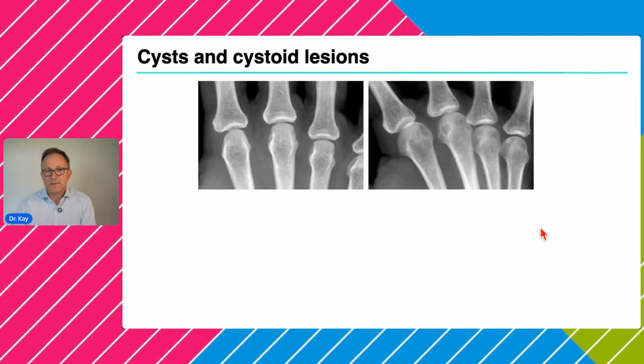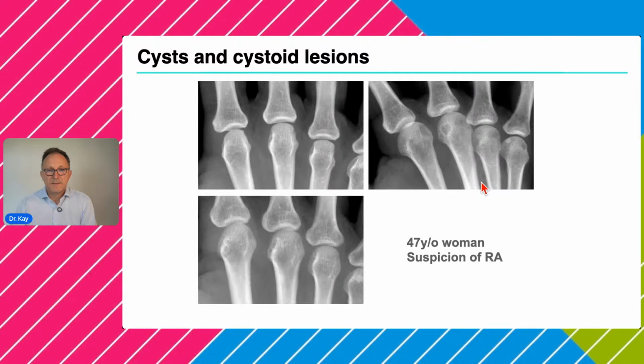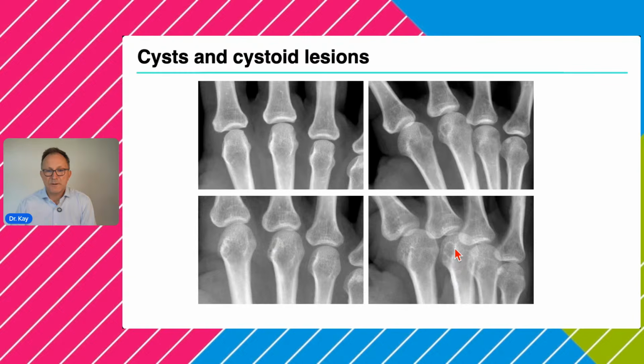So looking at a 50-year-old woman with a normal looking AP projection, maybe there's a small cyst over here, a small lucency in the oblique projection. You see this lesion over here with some slight sclerotic rim. And then there's this other 47-year-old woman, similar pain, similar X-ray. Now we have larger cystic areas over here, maybe here as well. And in the oblique projections, it looks more or less similar to this one.